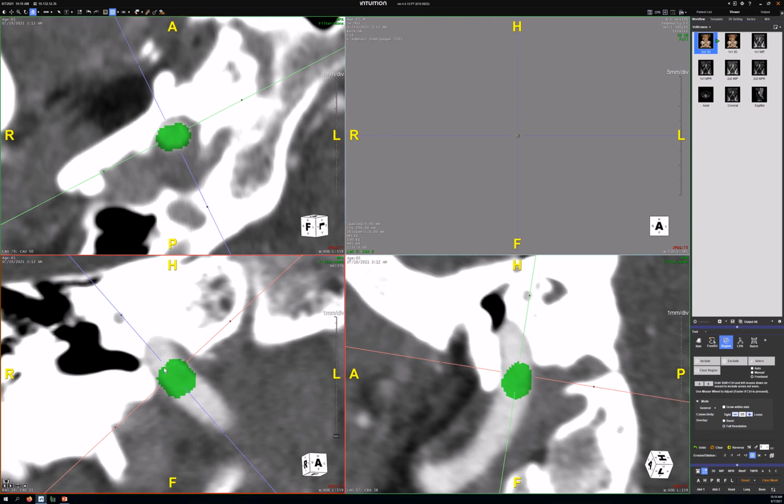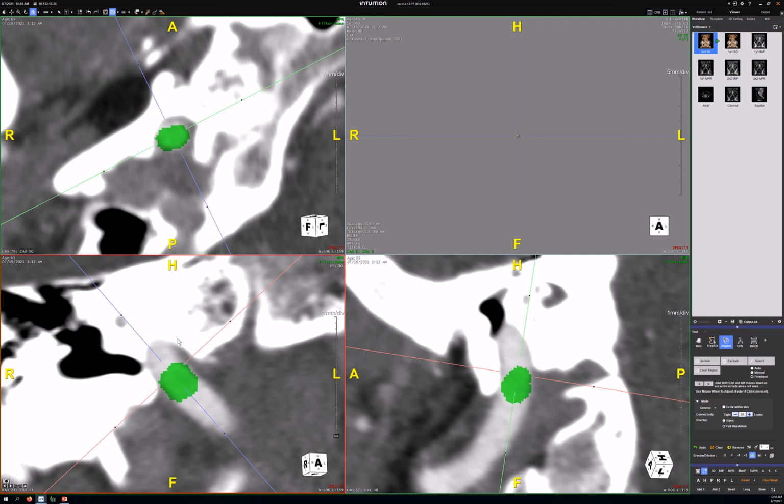Okay, so should we just do a couple more and then we'll stop the video? Come here, and what are you going to do? I'm going to get the center to the periphery, go halfway about here, and then hold the Alt key and click. And then we're going to have to adjust our axes. Let's adjust this one first, because this is the one you're farthest off on.